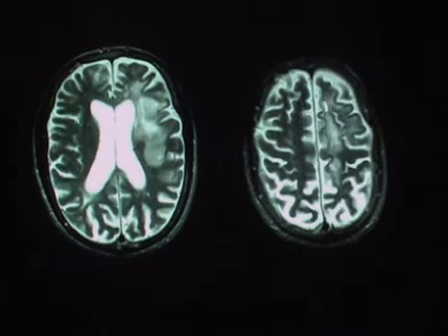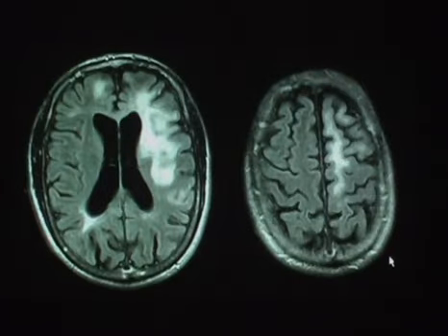So here's an example of PML with some fairly extensive white matter signal abnormality, predominantly involving the left frontal lobe, but extending from this periventricular region all the way to the convexity. And there's some mildly expansile appearance to this, but there's certainly some sparing of the gray matter that we can see well here. The same patient on FLAIR imaging, just demonstrating an additional lesion involving the right frontal lobe, but again, this mass effect and extension to spare the gray matter.